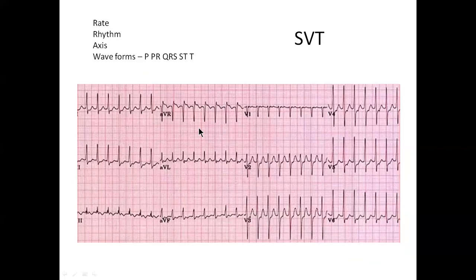Okay. Now I want you to spend a little bit of time and go through this rate, rhythm, axis, waveforms on your own and come up with your own conclusions. Okay, this is a supraventricular tachycardia.